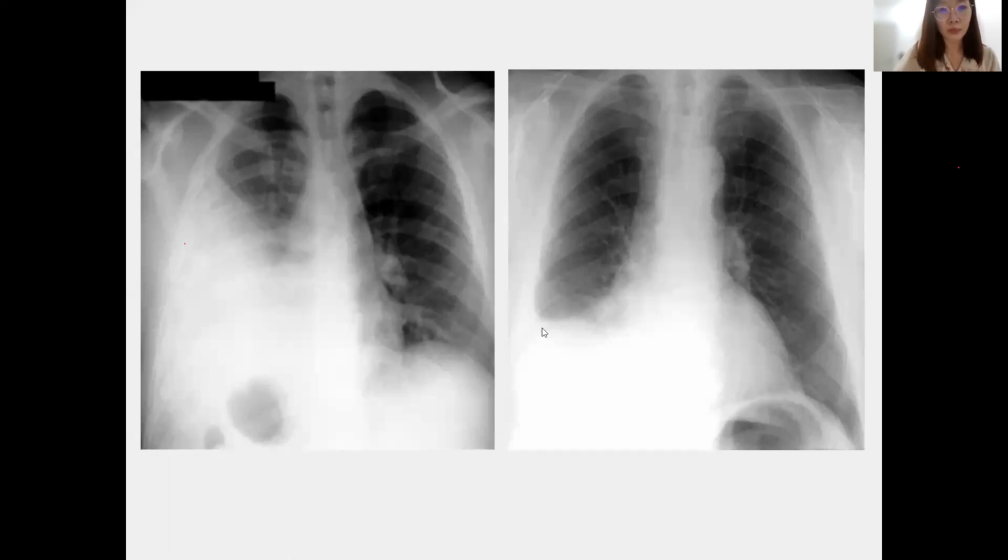So no one should miss a pleural effusion, but sometimes it's a bit difficult and tricky, where there's slight blunting of the costophrenic angle in a normal person. I always encounter that as well. Sometimes, if the rest of the lung fields are clear and the patient is asymptomatic, it might be due to pleural thickening. Sometimes when they do the X-ray, they are not taking a deep enough breath, and the costophrenic angle will be slightly blunted as well. I noticed.